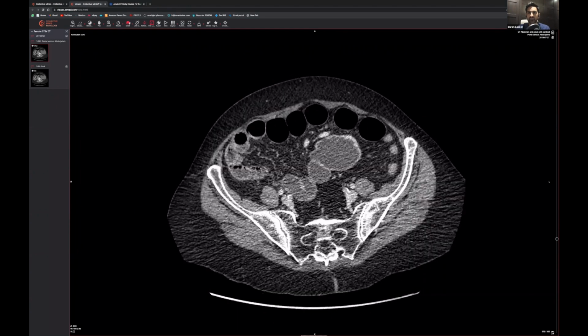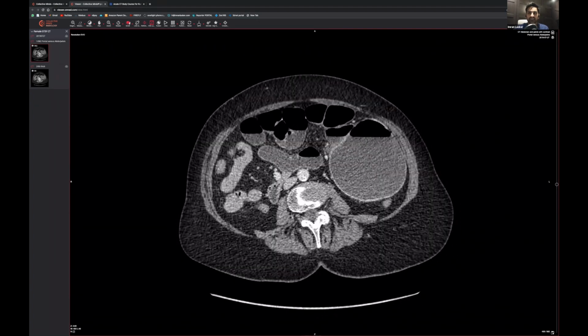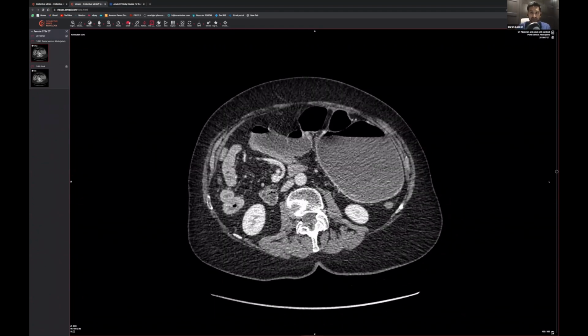Very hyper-enhancing. What can happen is that before the cecal pole becomes compromised, the blood flow doesn't go as well because it's so edematous. So I think it starts to hyper-enhance, and then it may end up having a perforation or it may end up having ischemia. So this is a cecal pole, and I think this is starting to get compromised because of how much pressure is involved here. And therefore it is a surgical emergency.